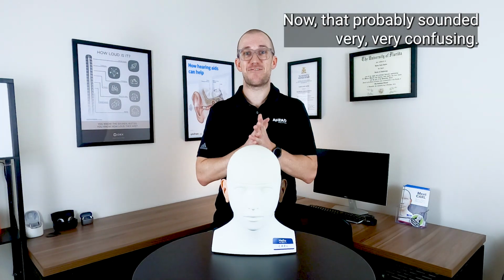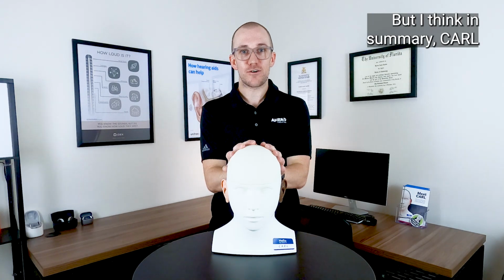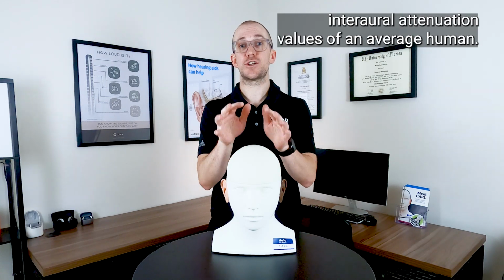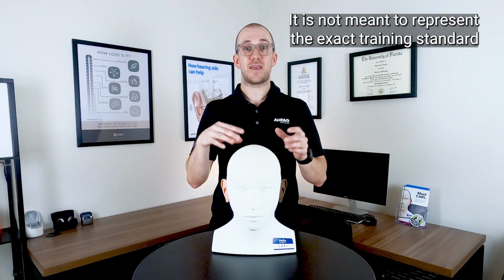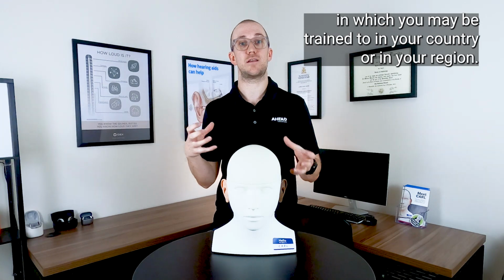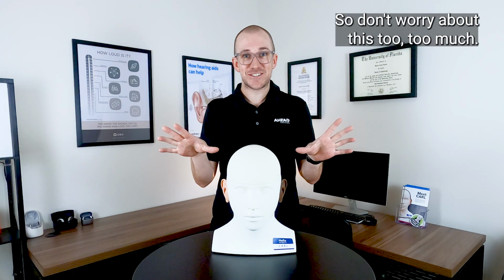Now that probably sounded very confusing, but I think in summary, Carl is made to represent the crossover and interaural attenuation values of an average human. It is not meant to represent the exact training standard in which you may be trained in your country or in your region. So don't worry about this too much.